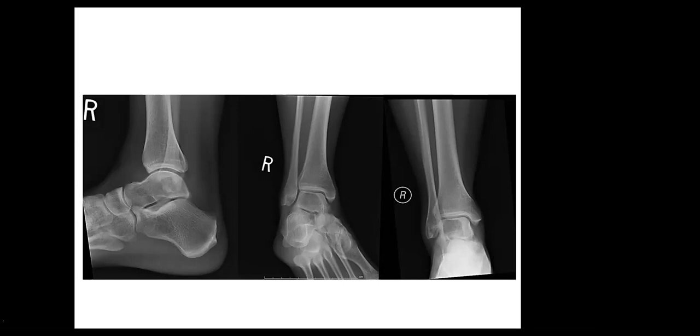No other finding. No joint effusion, no soft tissue edema. If there is any MRI. Sorry, are you making a recommendation for further imaging with MRI?